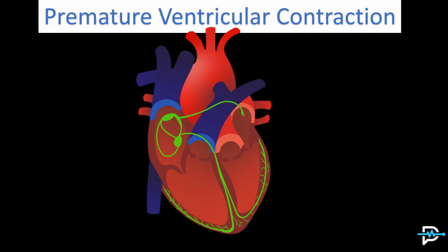So we'll end this episode by talking about ectopy. One of the biggest pieces of ectopy you'll see is PVCs, premature ventricular contractions. This is where a contraction in the heart happens a little bit too early, down in the ventricles, before the SA node can recover and fire again. So instead of the SA node firing, you get something down here in the ventricles that fires before it has a chance to. That's usually just because it's an irritable part of the heart for one reason or another.